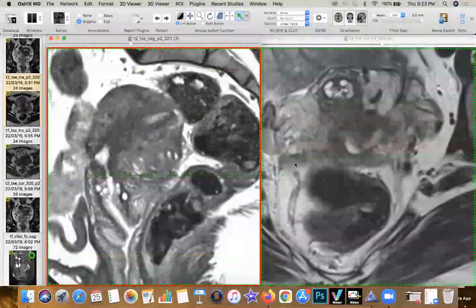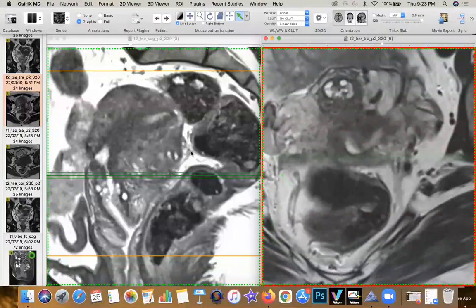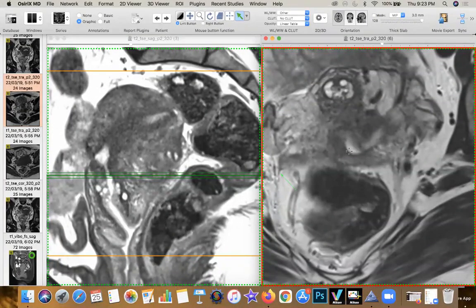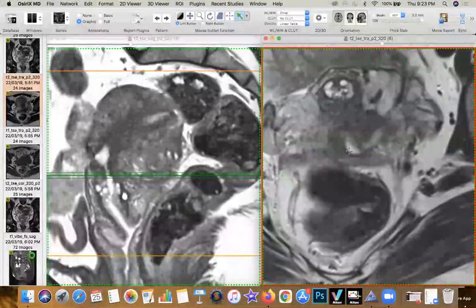You can see where the crosshair is going through. That's a typical location of the uterosacrals. And you can see that the uterosacral will be tethered, contracted, and you'll not be able to get the ballotability of the uterus because now the ligaments are fixed and it's not going to allow you for movement.